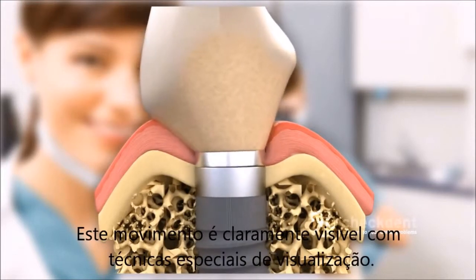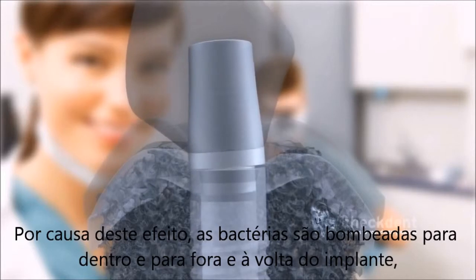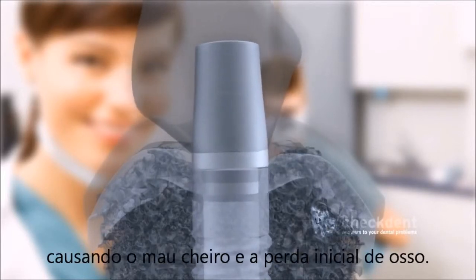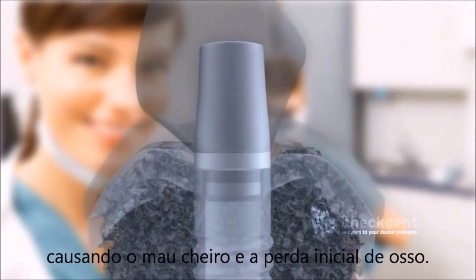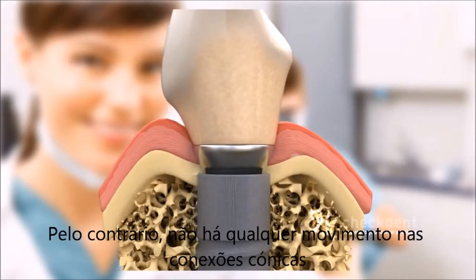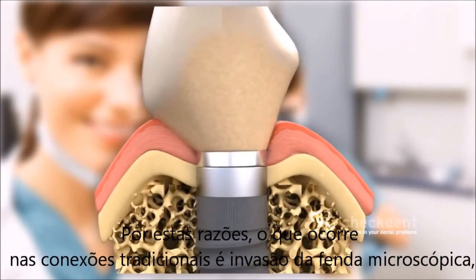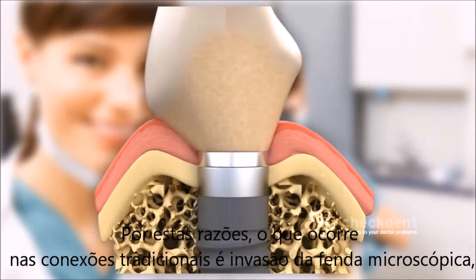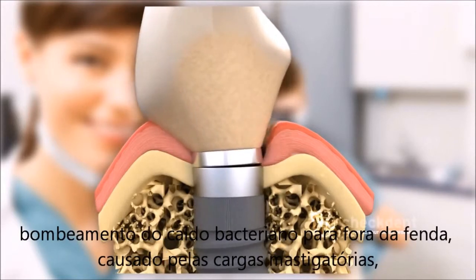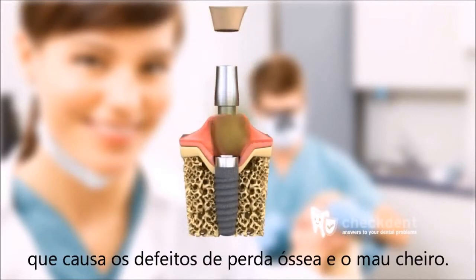This movement is clearly visible in the special images. Because of this effect, bacteria are transported outside and around the implant, leading to the foul smell and the initial loss of bone. In contrast, there is absolutely no movement with conical connections. Therefore, the results of conventional plug-in connections are a bacterial invasion of the microscopic gap. The chewing forces pump the bacterial soup out of the gap, leading to the plate-shaped bone defects and the foul smell.